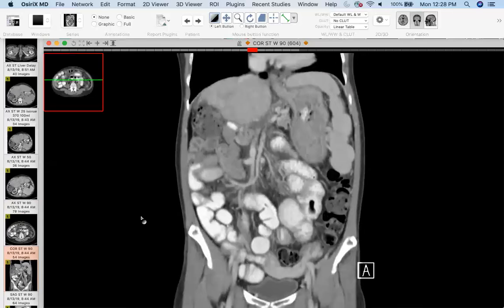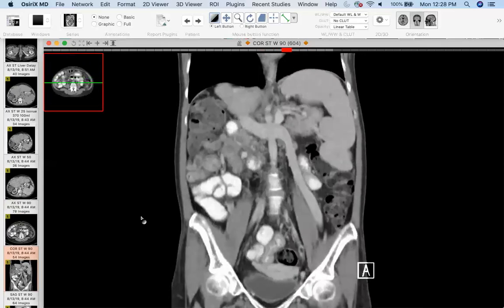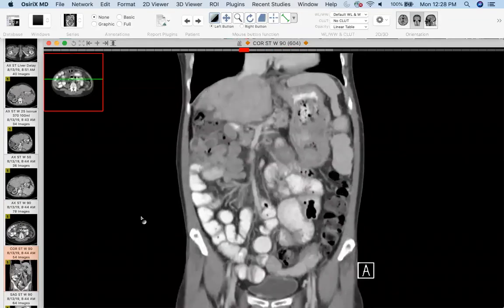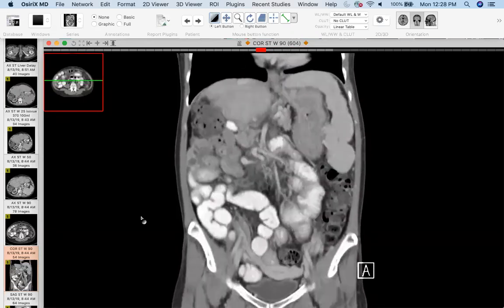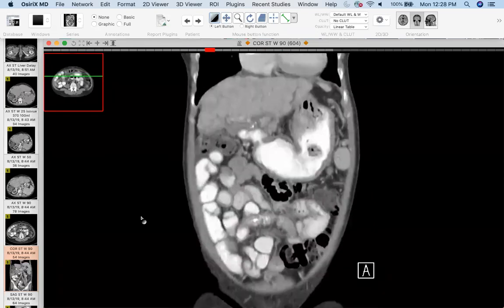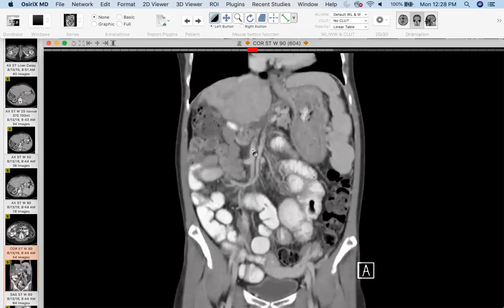What's the Abernathy one? Abernathy malformation is when you have the portal vein gone. No, the portal vein is here. So wait, I see the main portal vein, I see the SMV. Wait, where's the IVC? So this is the SMV. So I think the SMV is fine.